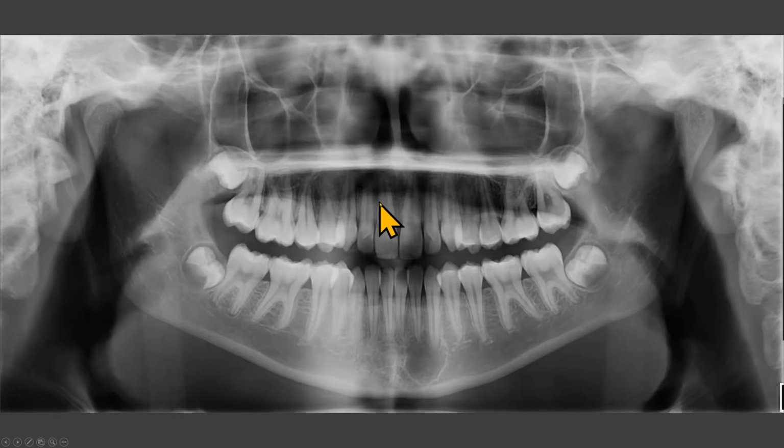This is a very common error. On this radiograph also, the dorsum of the tongue was not in contact with the hard palate. Therefore, analysis of the periapical region of the maxillary teeth becomes difficult. Other than this tongue position error, this panoramic radiograph is excellent for interpretation. The linear band that we see here is the head positioning guide. The shape of this guide varies from machine to machine.